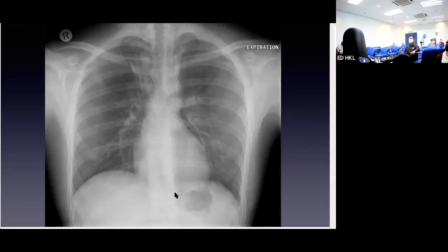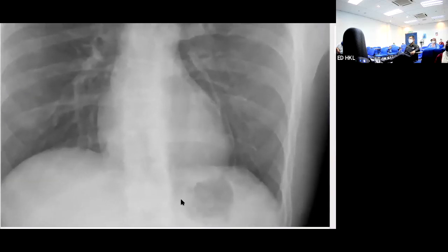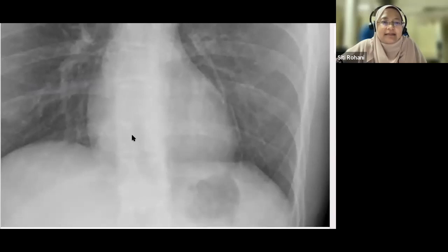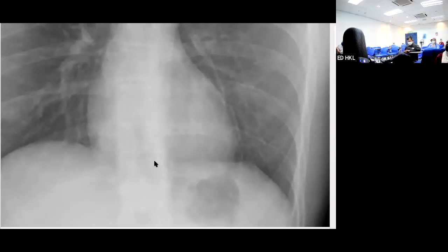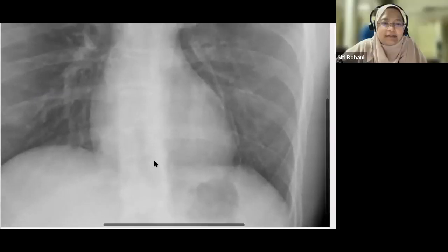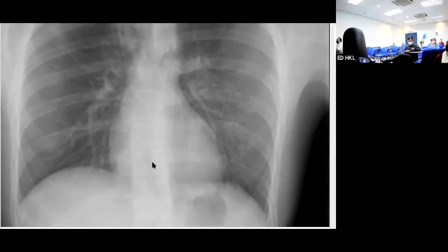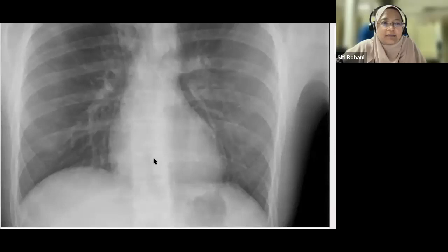How would you describe that if we were to communicate? Okay. You can see the vertebra. How would you describe that in a radiology report? This is anterior junctional line. Ah. And the visualization of anterior junctional line is not specific for pneumomediastinum.